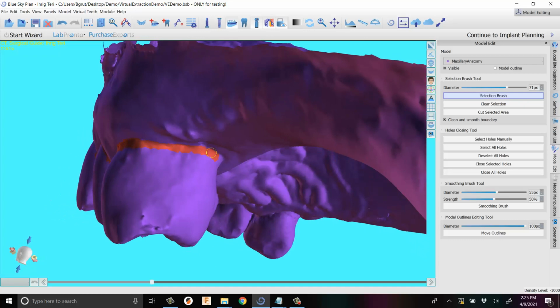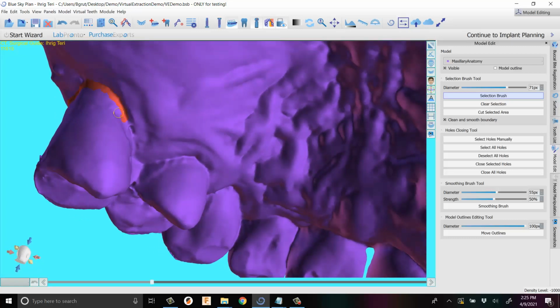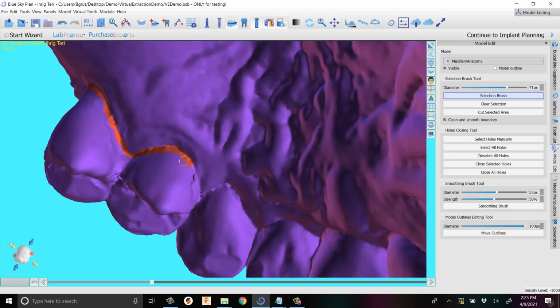I feel like I should change the color of this model. I don't know how well these colors are showing up. It doesn't look great on mine. All the dark model colors are pretty hard to evaluate, so I apologize about that.